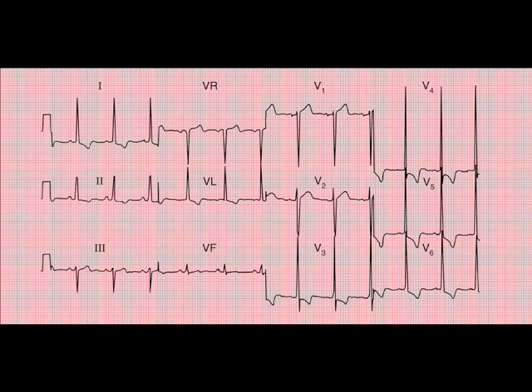So it isn't unusual that the cardiac axis is heading towards lead 1 because you're getting an enlargement of the left ventricle. Having said that, that axis could be normal for that patient, but it is interesting that it heads particularly towards lead 1. I sometimes say to my students, what about a very fit person who does a lot of gym work, a lot of marathon running? They also could have an enlarged left ventricle and could show these signs of tall R waves. How might that differ? Well, of course, students will say to you, look at the patient, they're a fit young person, whereas this patient obviously has some kind of pathology that's caused this.